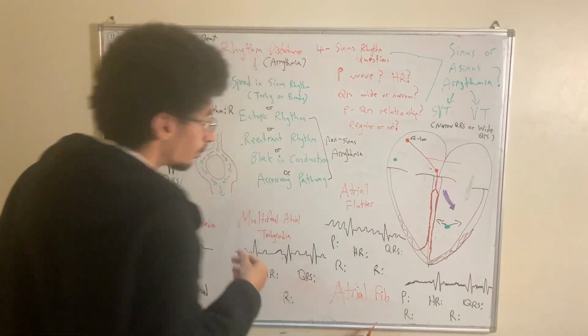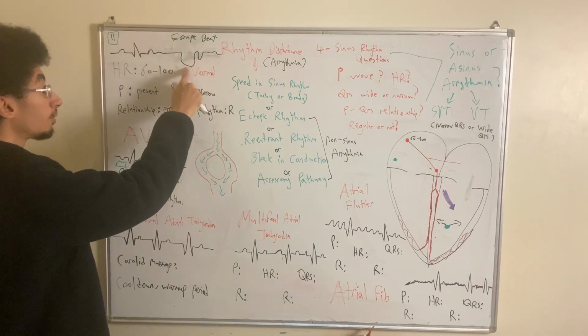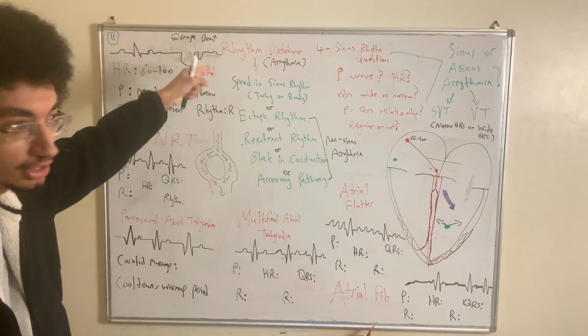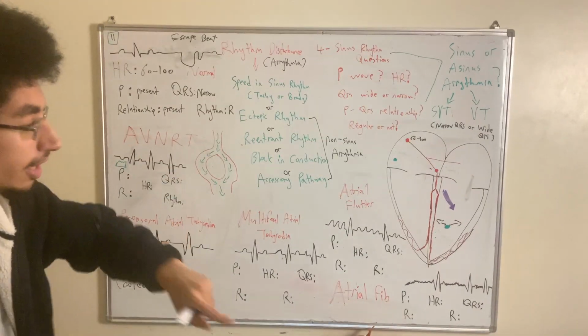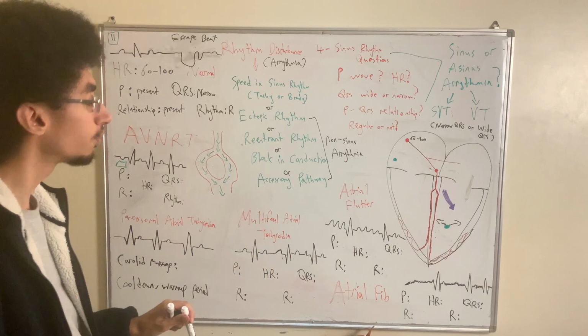So what does that mean on an EKG reading? That means the QRS complex, what you're seeing here, will be wide. It will be wide and bizarre looking because what is actually depolarizing the ventricles is the pacemaker cells of the ventricles. And these pacemaker cells are depolarizing, but they're way too slow and way too inefficient.